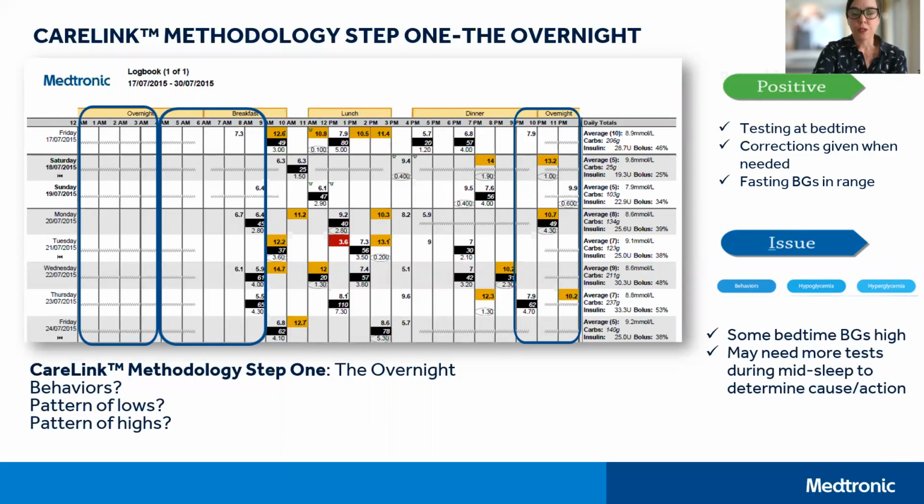If and only if we wanted to understand what is happening throughout the night, your healthcare provider might ask you to do several overnight mid-sleep tests so that we could determine, are you spending the majority of the night where you're waking up in range, or is it taking some time for those bedtime BGs to come into range? And is there improvement that can be done there? But that would be really fine-tuning.